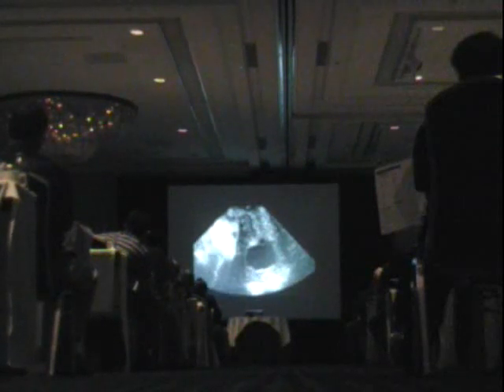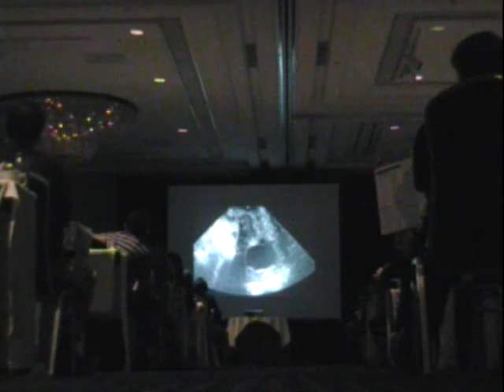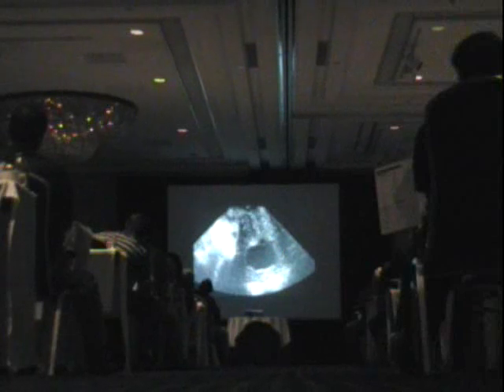If anything's built up in there, then something's wrong. There's some sort of outflow obstruction. And here's an elderly patient who presented with pain, no discharge, no bleeding, because of course the problem is that her cervix is stenosed, and she had this complex fluid in the endometrium that represented pyometra when they put a catheter in.